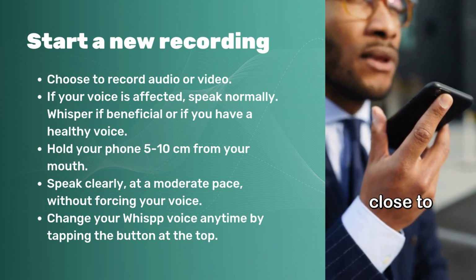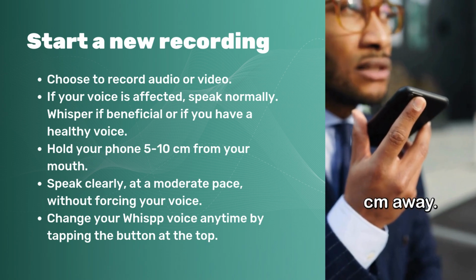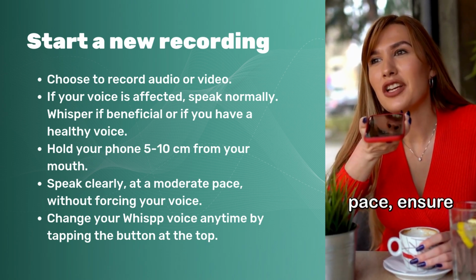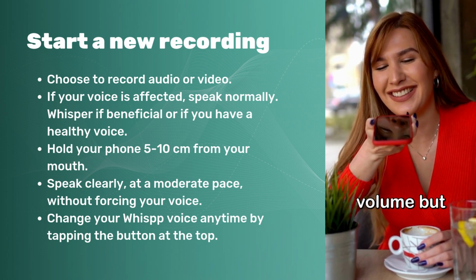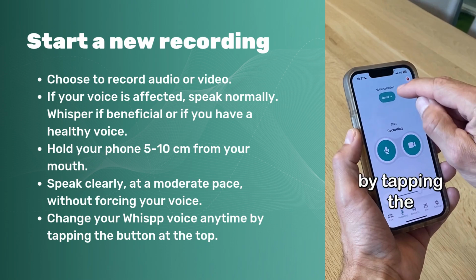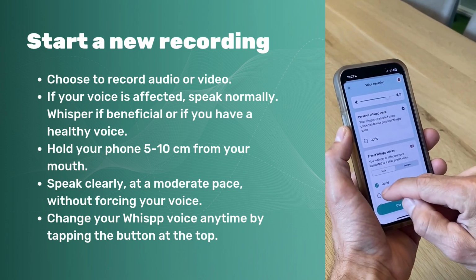Keep your phone close to your mouth, about 5 to 10 centimeters away. Articulate clearly, speak at a moderate pace, ensure audible speech volume, but don't force your voice. It's always possible to change your Whisp voice by tapping the button at the top.